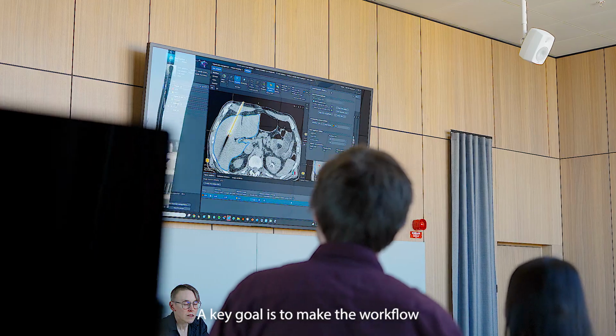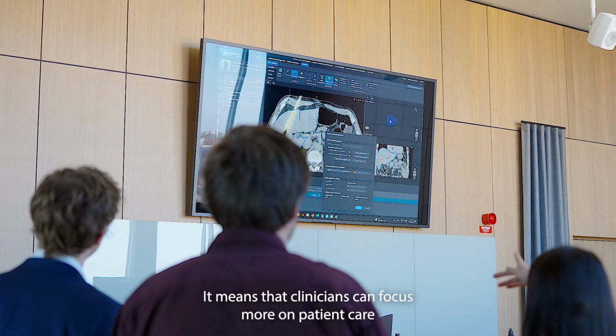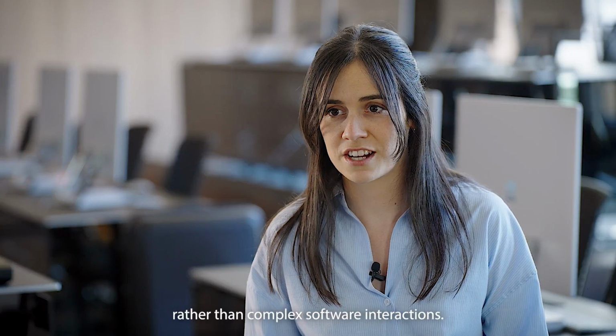A key goal is to make the workflow fully automatic with minimal user input. This means that clinicians can focus more on patient care rather than complex software interactions.